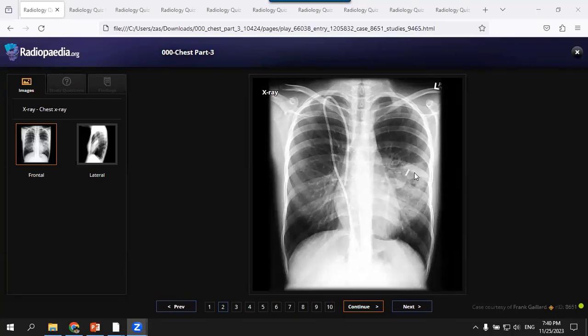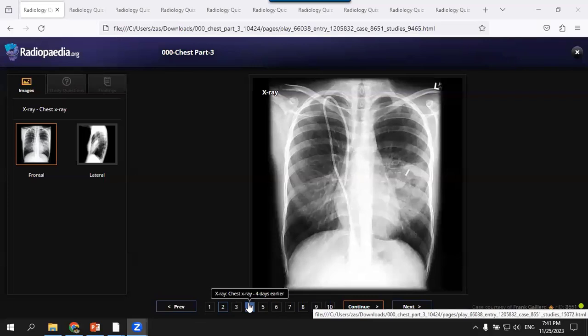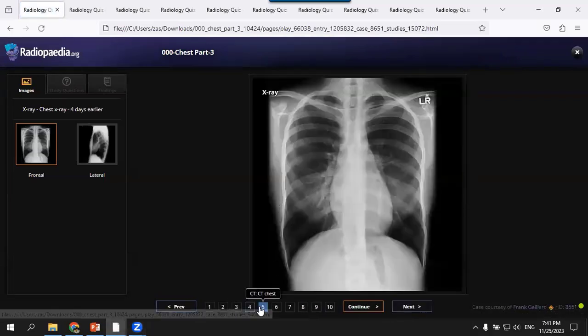Is this most likely a metallic part outside the body? This could be a tunneled catheter, a single line catheter, so it could be for chemotherapy. In such a case, a patient undergoing chemotherapy. What type of lesions may develop as patches? It could be fungal infections.